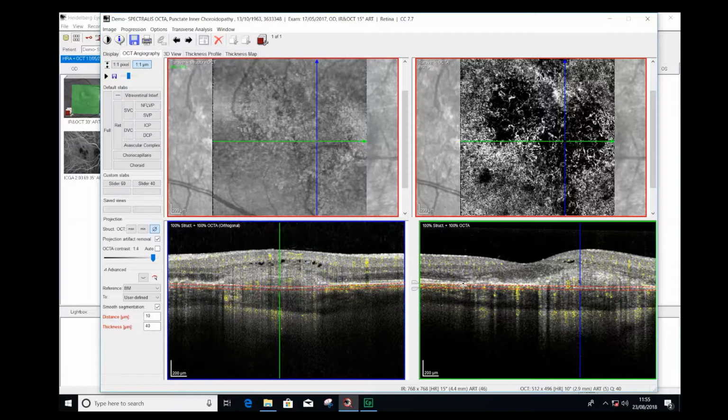One important or interesting area to note is in the bottom left corner of the choriocapillaris slab of the OCTA, where there is an area of apparent reduced flow. It would be interesting to postulate what this may represent, either masking due to lymphocytic aggregate or due to capillary dropout.